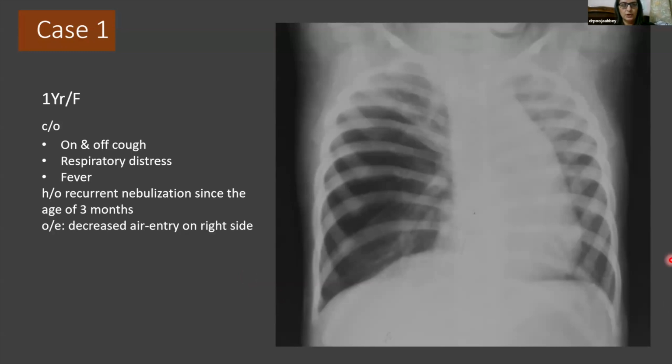And this was the chest radiograph, representative chest radiograph. So what do we see here? We can all clearly see the abnormality here, right? And this is definitely in the lung. And what is it actually? So there is a focal hyperlucency, which is seen here.